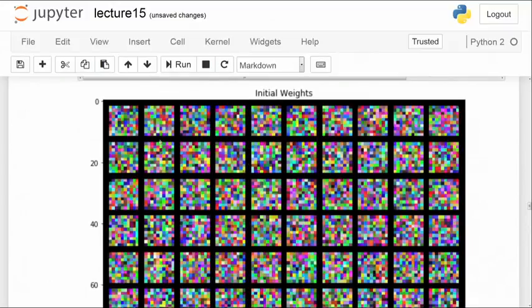Now, this is basically a matrix of how these weights are associated. You see a lot of colors there. The reason you see these in color is because your input is 3 into 10 into 10. So, you would have 3 channels, each of size 10 cross 10, or 3 planes which are matrices, each 10 cross 10, and you can associate that the pixels connecting the red channel of your image are the ones visualized on the red channel in this visualization.